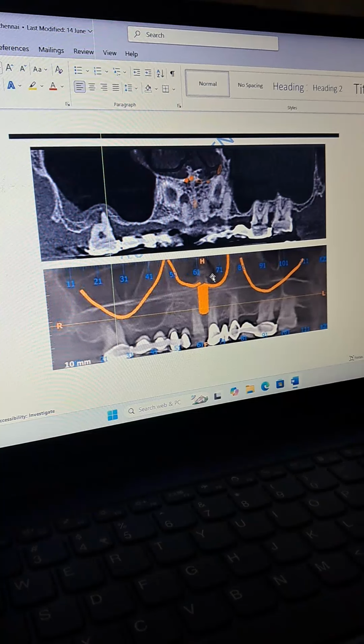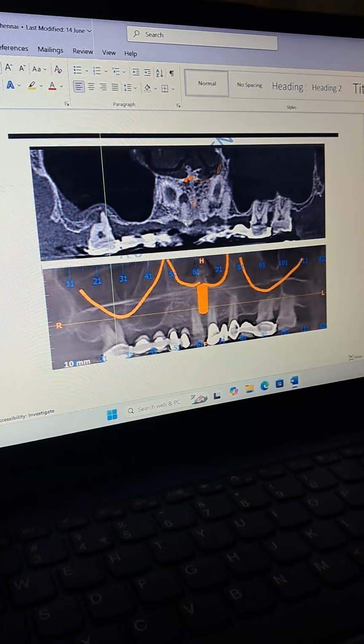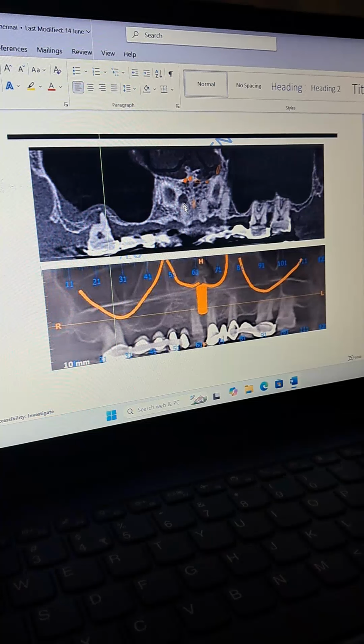Coming to corticobasal implantology for this particular case, these cystic areas are to be curetted thoroughly during extraction of the root piece. You can see a root piece here, a root piece here, and a root piece here. After curettage, only the drilling should be performed. There are two benefits of curettage in this case.